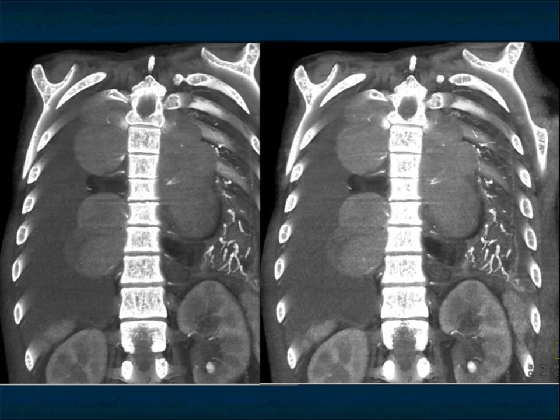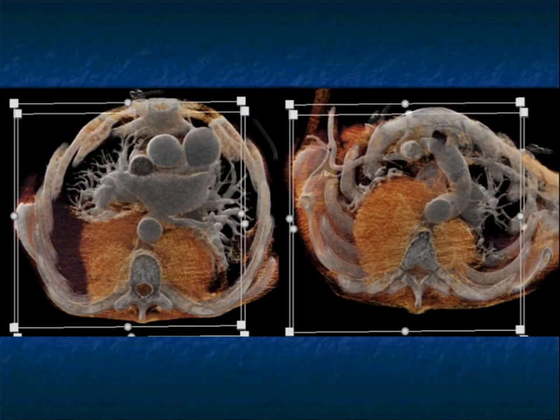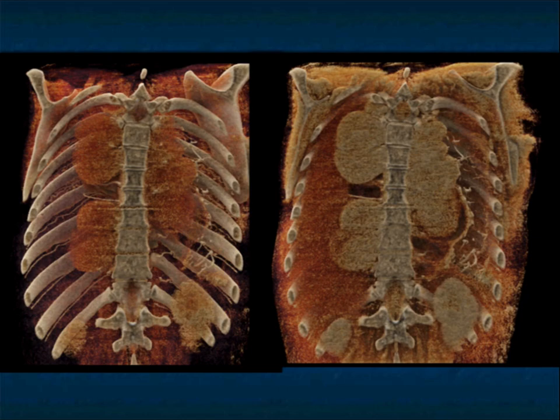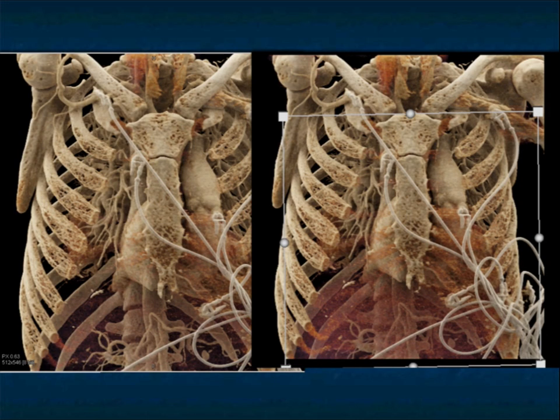Well, the answer of what this could be is extramedullary hematopoiesis. This is a beautiful example of extramedullary hematopoiesis. And what disease does this patient have? Thalassemia. You can see in cinematic rendering just a beautiful visualization of the density of these para-aortic or paraspinal masses. And again, lobular masses. This was not a vascular process, which was a good consideration. Lymphoma, metastasis, all things you would think about. But when you see the extent of this process and you see the bony changes, it's just the best example I think I've seen of beta thalassemia.